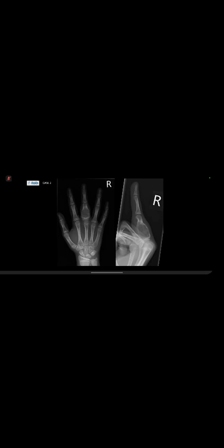Can I know what the patient has presented with, the history for the patient? They had trauma playing netball, and they had some pain in their ring finger. So based on the presentation and the age of the patient and the location of the lesion, my first differential would be enchondroma, and I have never seen ABC here, but it could be a simple bone cyst. Yeah, the lesion is more epimetaphyseal.